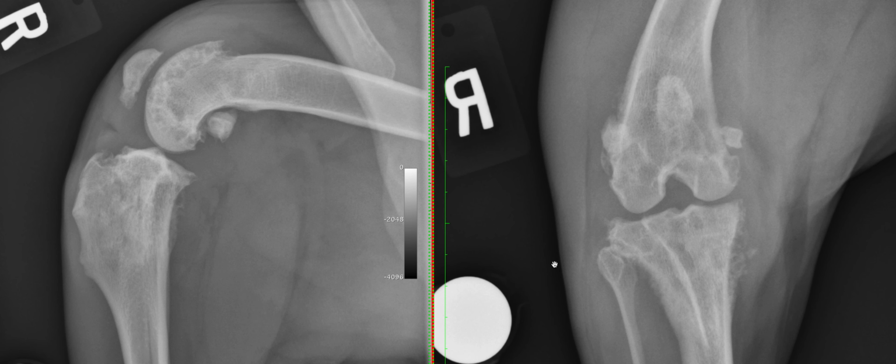So overall, all those features combined, as I said, are more the sign of an aggressive process in that stifle. And when we mean an aggressive process, it's something with some osteolysis involved, usually. And that would either be due to neoplasia. In that case, because it's centered over a joint and there is quite a large soft tissue component, we would think more of a joint neoplasia, like a synovial cell sarcoma or an histiocytic sarcoma.